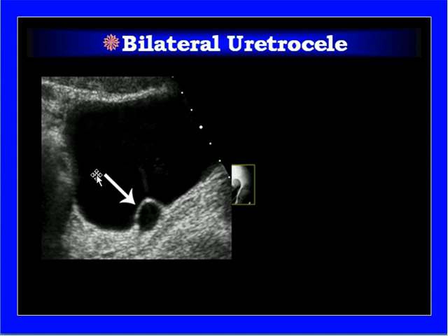Ureteroceles, again not very uncommon, but they do occur in small children as well as in young adults. And you can see a cystic structure present at the right vesico-ureteric junction. When the urine comes from the kidney, this balloons out, and then when the urine is pushed out from the vesico-ureteric junction into the urinary bladder, it collapses. So it keeps on doing like this.